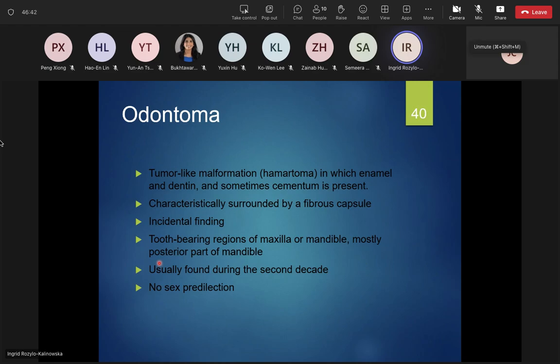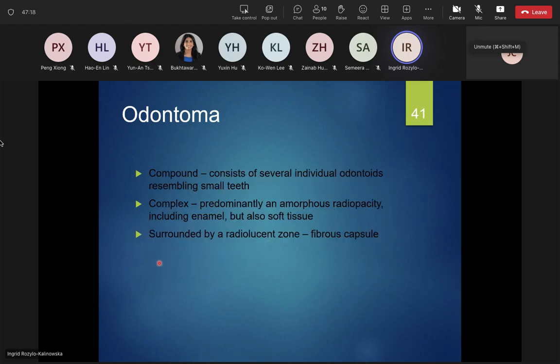So the patients have panoramic radiographs due to orthodontic indications, but it's also the age of observation of delay of eruption of some teeth, and when primary teeth are still present in the dental arch, it makes a doctor search for the reason why the tooth is not visible in the dental arch. And then they request radiography.